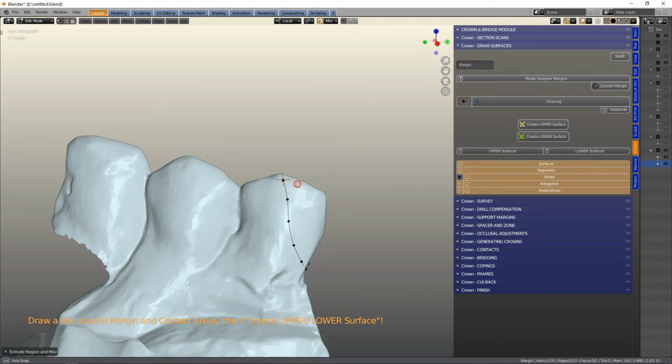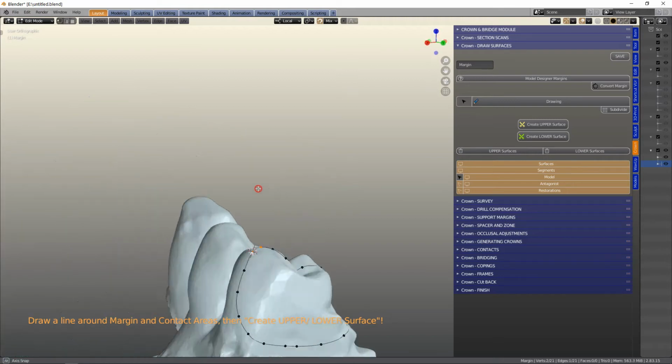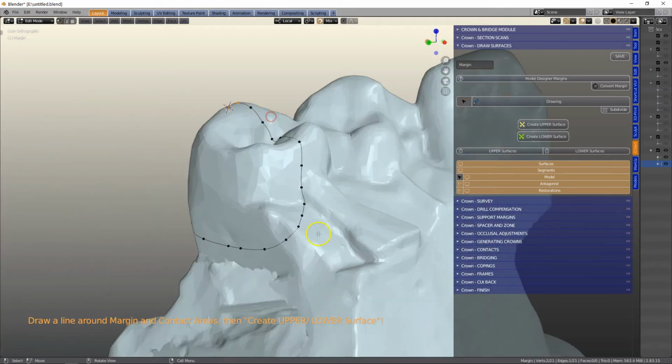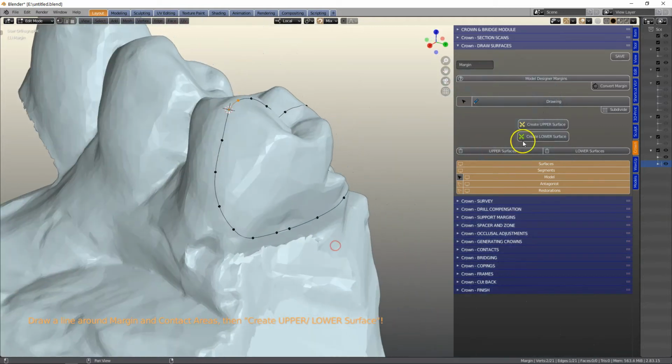So we want the extrusion to go down with the actual vertices. Okay, so if I pictured drawing lines down, it can all draw nicely.